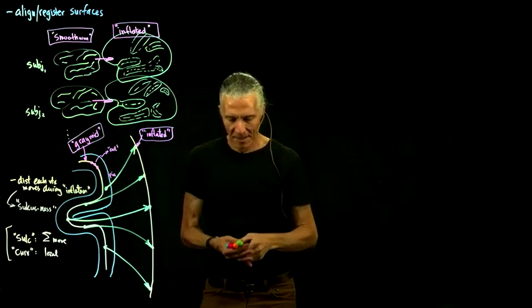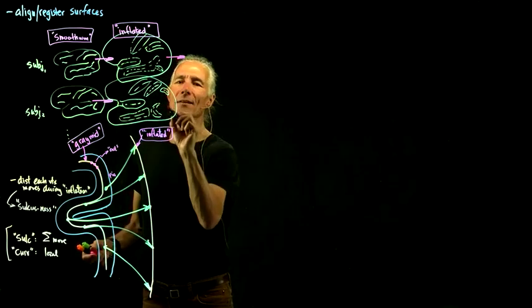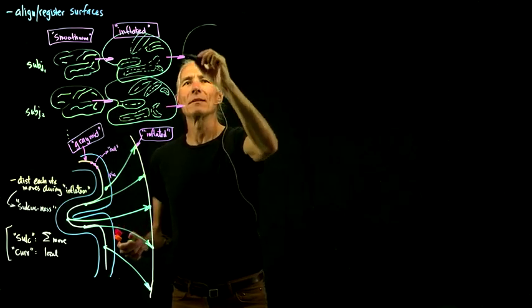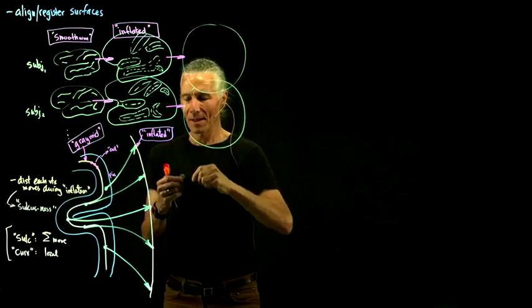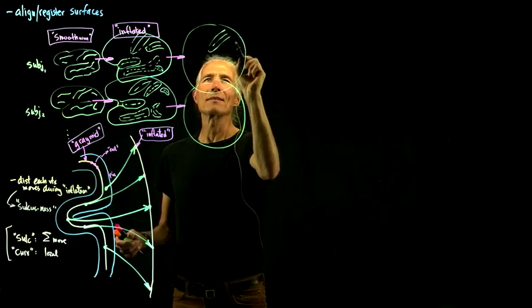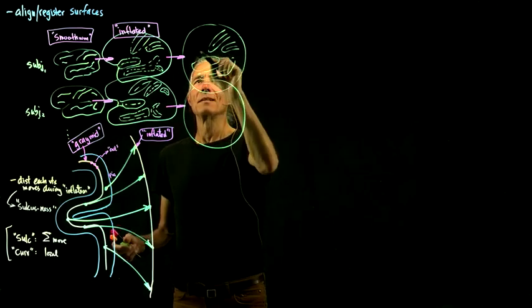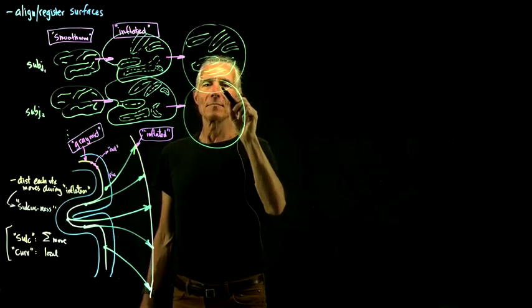The idea is that you first force everybody into a standard sphere. Our standard sphere is like a 10 centimeter diameter sphere. So blow everybody up into a sphere, and you'd still have all the sulci on there. If you look at these spheres, after a while you can see, oh yeah, it just looks like a lateral view of the brain. Here's the STS. Here's the lateral sulcus. There's one of the frontal sulci. So basically, blow everybody up to a sphere.